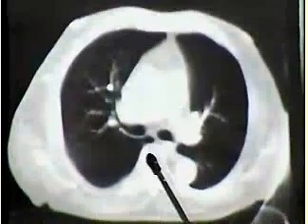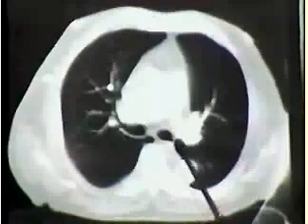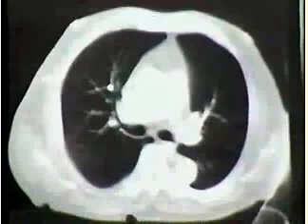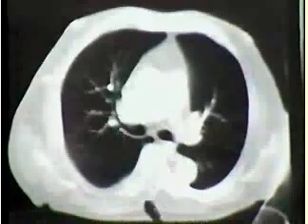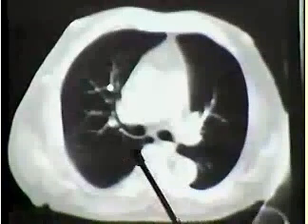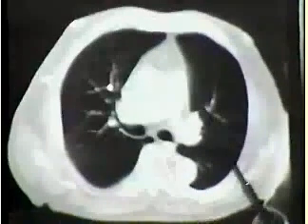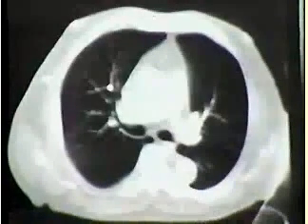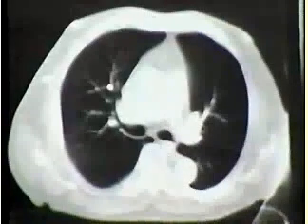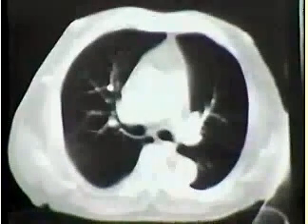If you look at this region with the help of the lung window or an intermediate window, these windows which show you the vessels very faintly but show you the intraparenchymal structures, I think are very useful for this kind of analysis. Here we are again at the level of the takeoff of the upper lobe bronchus, the thin posterior wall with air going into the azygoesophageal recess. A little bit of tissue between the two bronchi, just at the level of the carina, with fat, this darker gray, in front, and a little bit of fat behind next to the denser shadow of the esophagus.